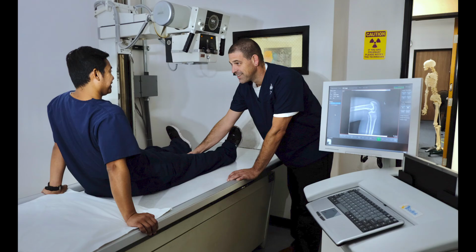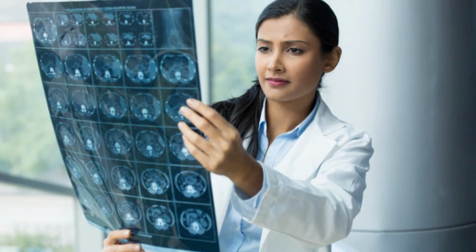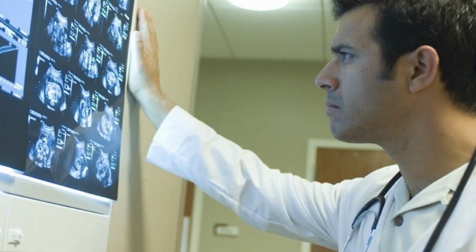Lead markers generally serve as a way to indicate the left-right orientation of the subject of the X-ray, as well as other important details such as body position, time of procedure, and the initials of the radiographer performing the X-ray. The marker should never obscure any part of the patient's anatomy. These can interfere with the medical legal validity of the X-rays, and possibly with the medical assessment of the image. All identifying information should be clearly legible and not overlap with any other markers.